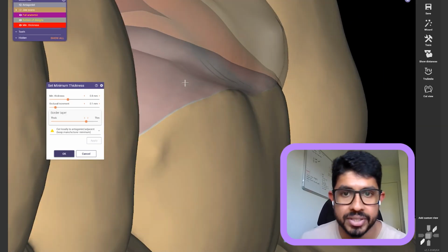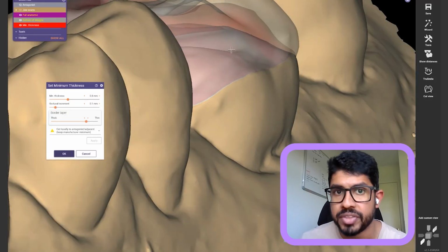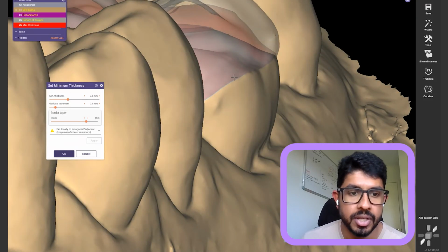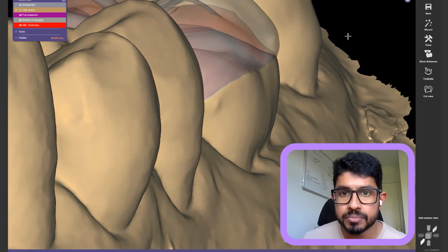You're going to go ahead and bond this in. It's going to do a good job. You want that occlusal minimum thickness, but you don't need that on the axial. So I've done this and I hit OK.